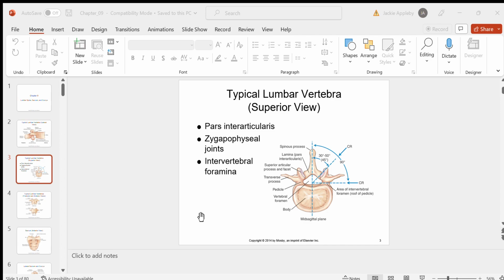So on the articular, I can't remember the words. On D and E. Yeah. I'm looking at that and I don't see anything. Okay. So other than, I know that it's outlined. Yeah. So how do I identify it? I don't see anything. Yeah, I mean, other than I know it's supposed to be there. I mean, you know it's supposed to be there for one. You know where it should be, right?